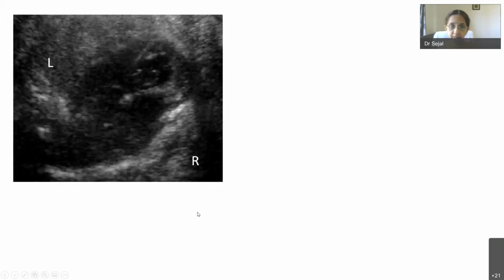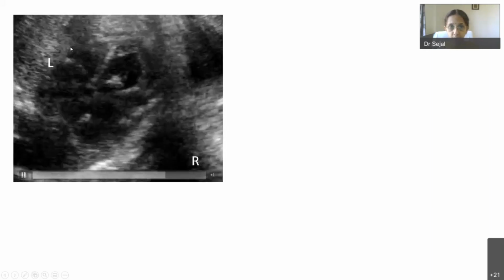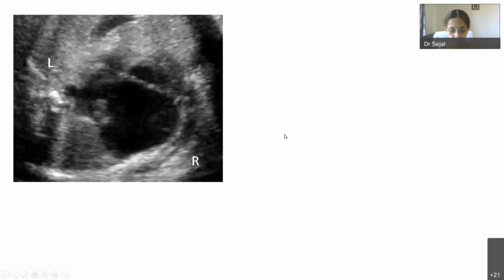All of you can see this. It's a simple video, just a 4-chamber video. And because I've not shown the situs, I am writing it here. This is left and this is right. Do you see anything abnormal?